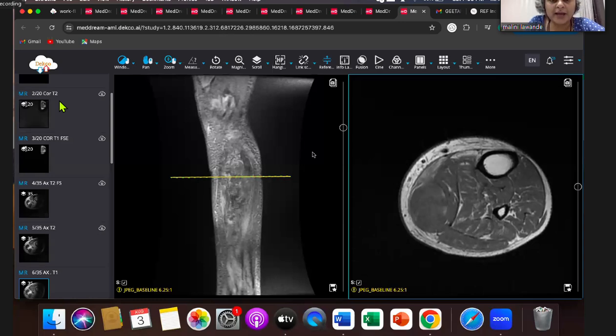Neurofibroma versus schwannoma, I already answered that. Hematoma and tumor. Again, I said, if it's not a typical location, if you see any solid areas, give contrast in what looks like a hematoma also. But remember, do a pre-contrast FATSAT T1 and post-contrast, so that you can subtract that. Otherwise, in a T1 hyperintense area, you'll never know whether it's enhancing or not. So subtract that and then look for it.